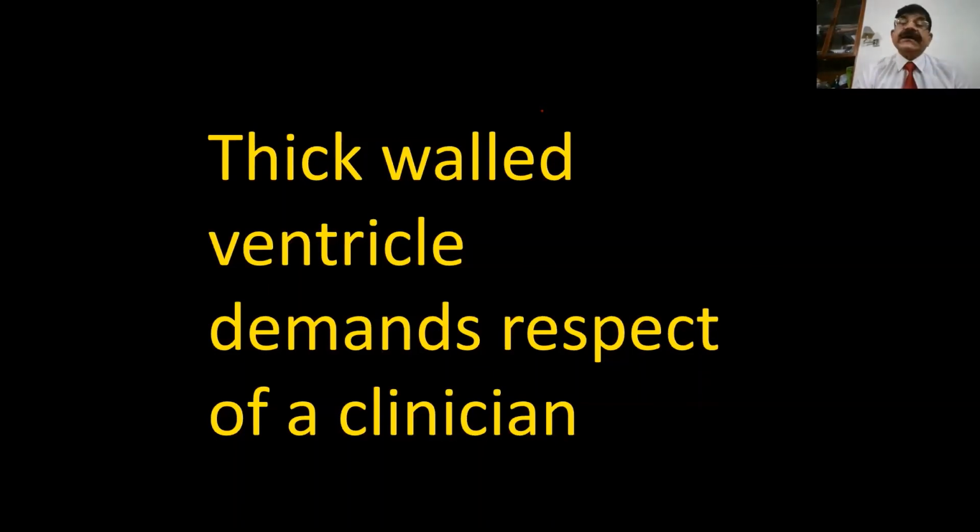It is a difficult thing. If you see, of course, SAM and you see marked asymmetric septal hypertrophy, you see paradoxical strain, you see crypts, so you know that the two are combined. But if that is not there, you first have to treat the bicuspid aortic valve and later on realize, is there a residual hypertrophic cardiomyopathy?